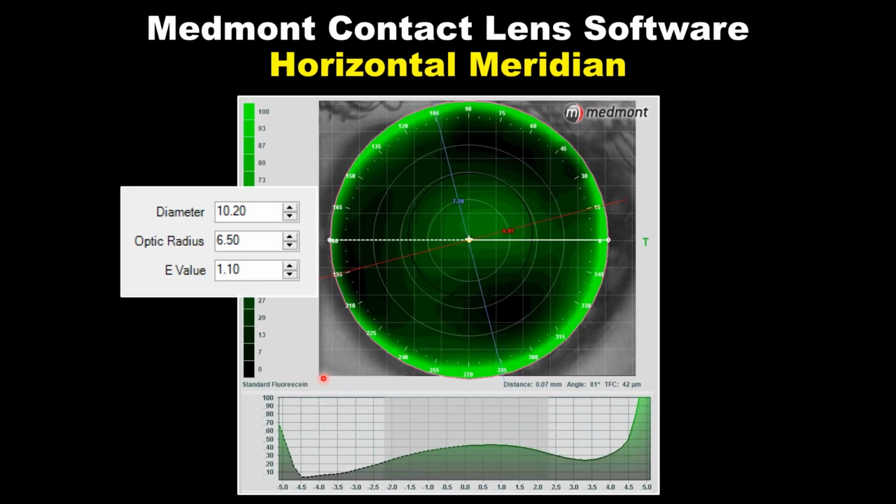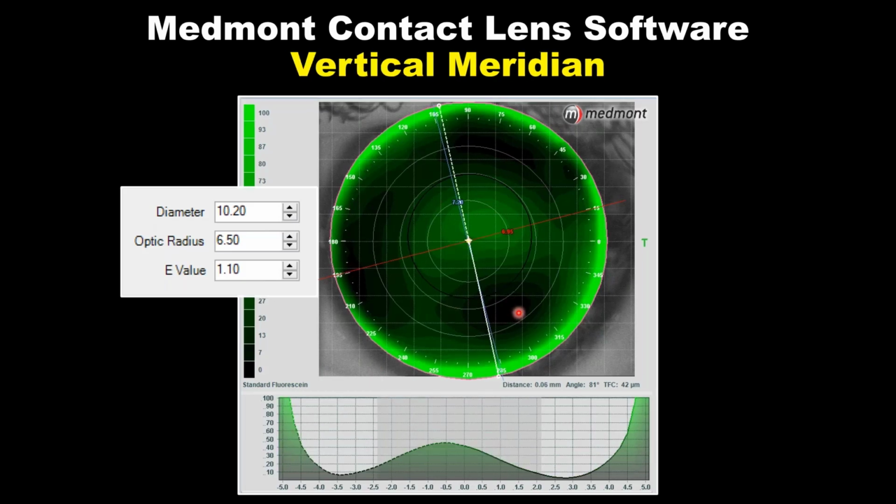Now let's put on a corneal GP in the contact lens software. Let's get a sense of if a corneal GP will look appropriate. Does it appear that it has hope of being successful? Are we confident that a lens, a corneal GP might work? And here we're seeing a relatively acceptable pattern. We have apical clearance. We're able to clear over top of the cone. We've got what appears to be 3 pivot points or 3 landing points for the contact lens.